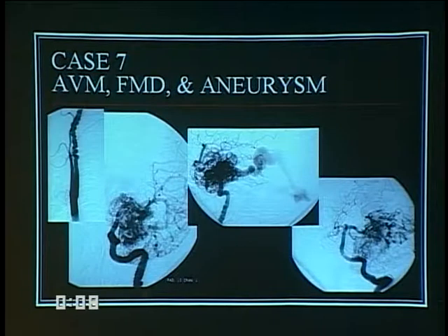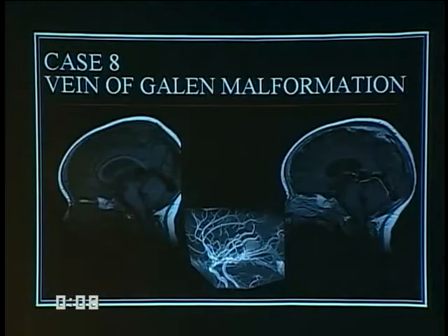This patient had a plethora of findings. Here we have that beaded appearance of fibromuscular dysplasia in the internal carotid artery, the arteriovenous malformation, the abnormal venous and arterial structures with early venous drainage. You've got all this arterial enhancement here in the carotid, and you already see the venous drainage that's abnormal. It's important to know whether the venous drainage is central or peripheral, how large the lesion is, and are there aneurysms or other associated findings, usually aneurysms within the nidus. This patient has a bonus aneurysm at the basilar tip. It's not really a bonus, is it?